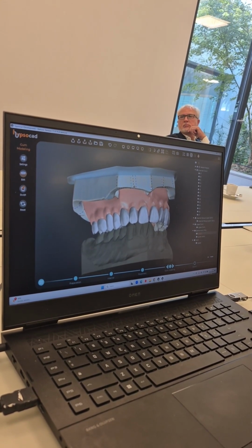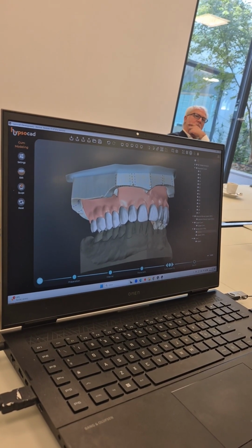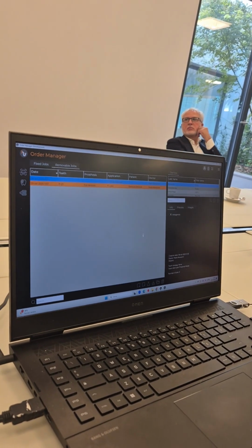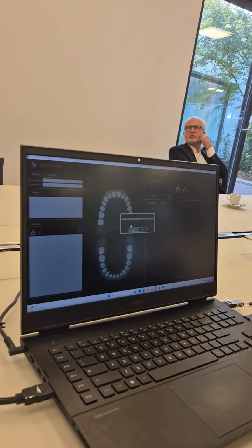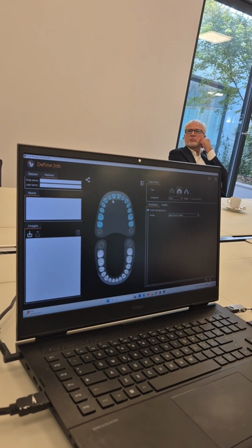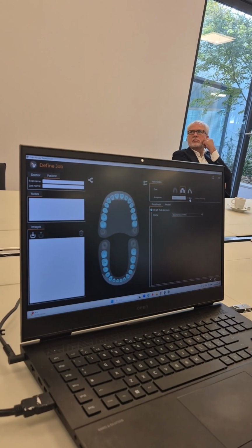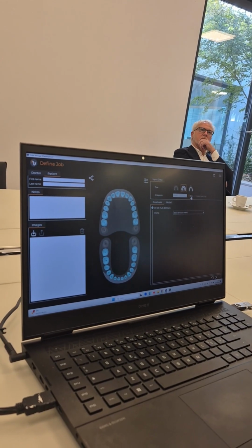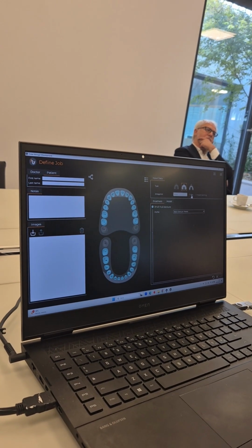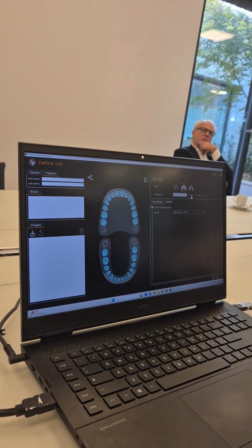And how does it approach the medial incisal line, to have the correct line for the different classes? There is a preset. Or if you want, for example, when you define a job in the removable part, you can select the full denture for the upper and the full denture for the lower. And you can select the bite. If you select the bite, you can import the STL to check the dimension, to check the occlusion, all things. And automatically the software places the teeth in perfect contact.